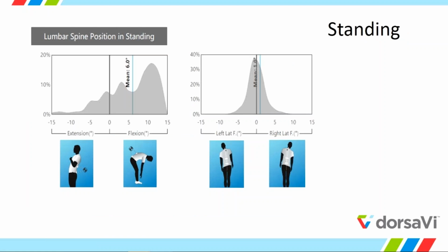This one I really like. Underneath that, on this same page, you can see your positional tendency throughout that time. This first bit has extension and flexion, the zero line being neutral. The normative mean is about 6 degrees of flexion in standing. And this person's gray shaded area indicates that they spent the majority of their time in this region, which is between about 6 and 13 degrees of flexion. It's where they tended to hang out during that time.